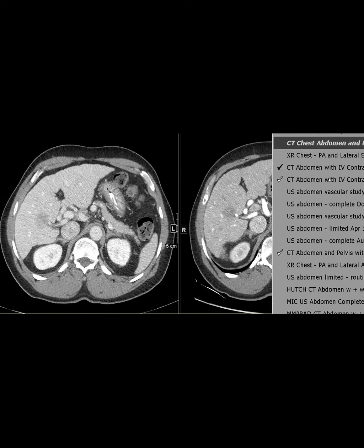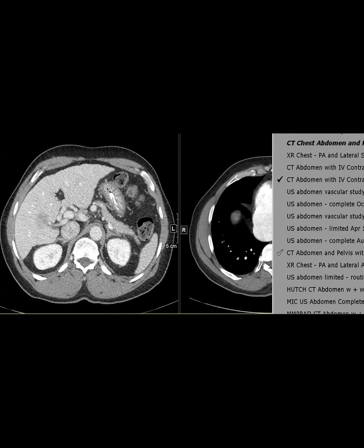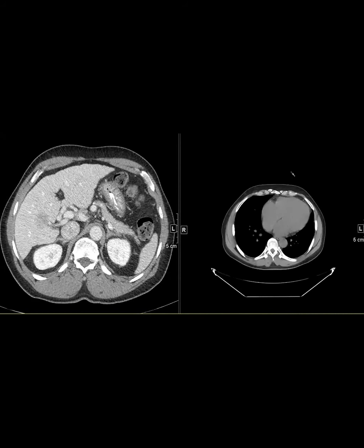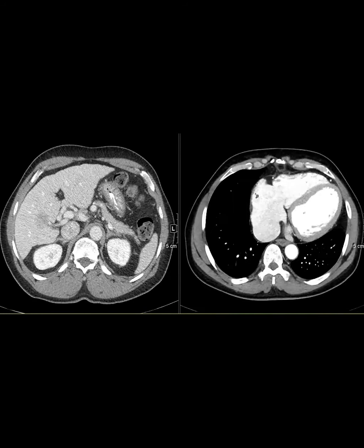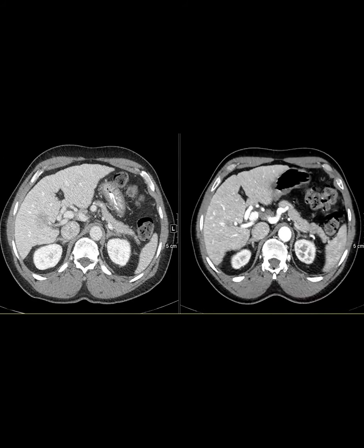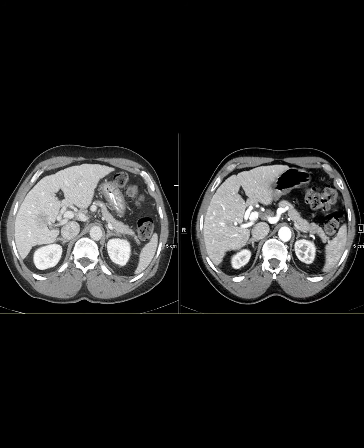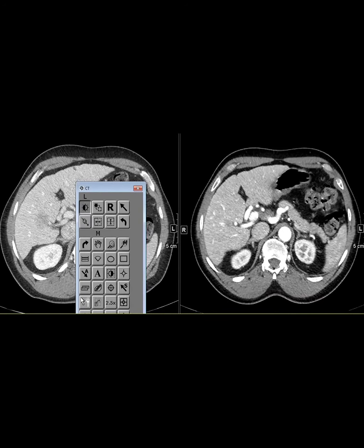And this patient had a CT from a couple years ago, and there was really not a corresponding abnormality in this region. Now, this was done as a urogram, so it's not a full study for our purposes, but even here you can sort of make out maybe there was something here, but certainly this part is either new or worse.